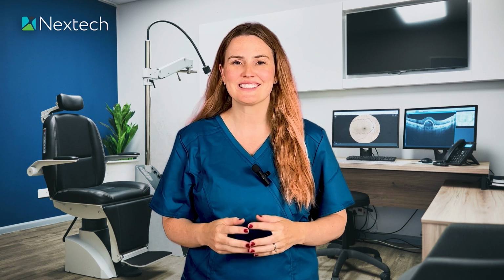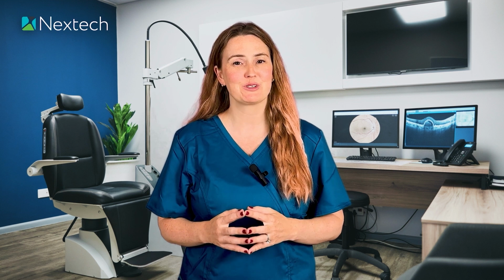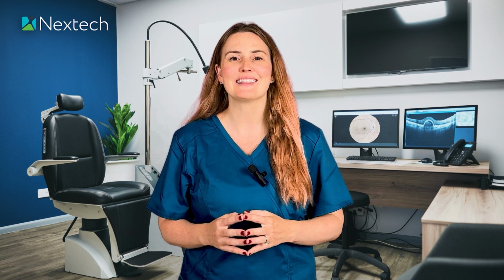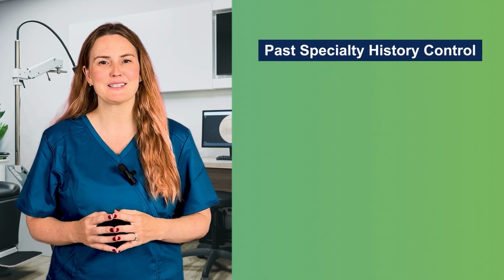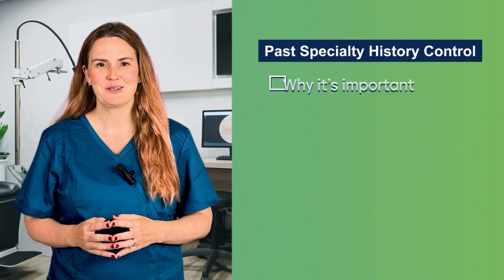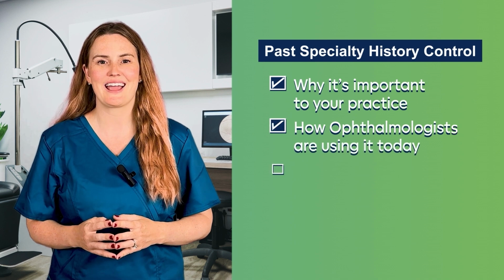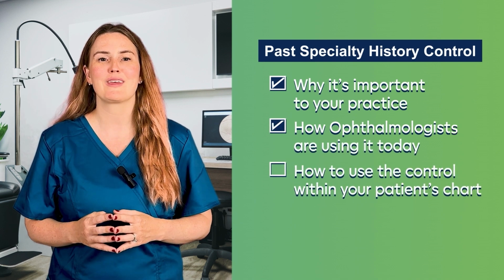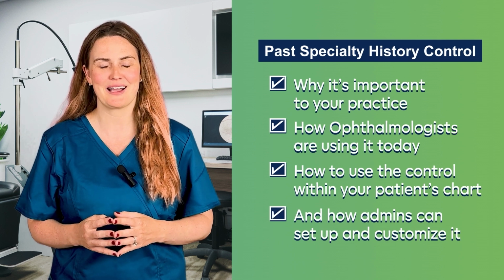In less time than it takes to complete most in-office procedures, we'll go over how you can reduce decision-making time, allowing you to optimize the overall appointment. We'll cover the past specialty history control, why it's important to your practice, how ophthalmologists are using it today, how to use the control within your patient's chart, and how admins can set up and customize it.